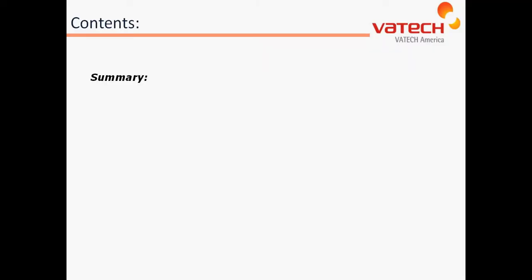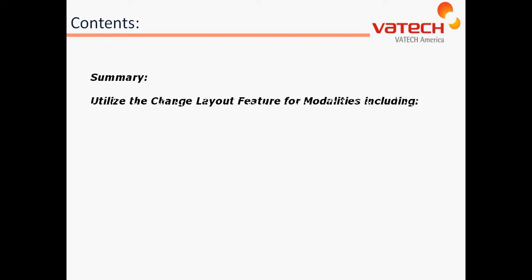This concludes our video tutorial on changing format. You should now be able to utilize the Change Layout feature for modalities including Panorama, Cephalometric, Intraoral Sensor, as well as Intraoral Camera.